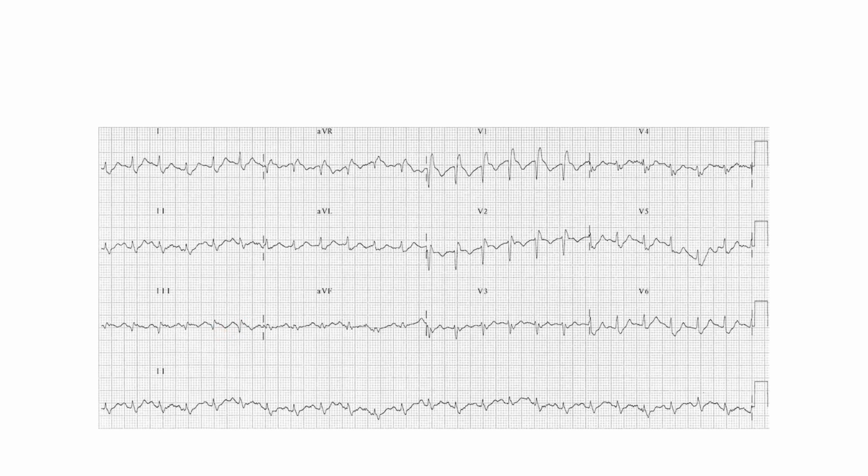And let's see what the axis is. The axis is isoelectric kind of, but maybe towards the right on both. Definitely a strange axis, but it's maybe just isoelectric, maybe to the right. Okay, so PE here was the diagnosis at least.